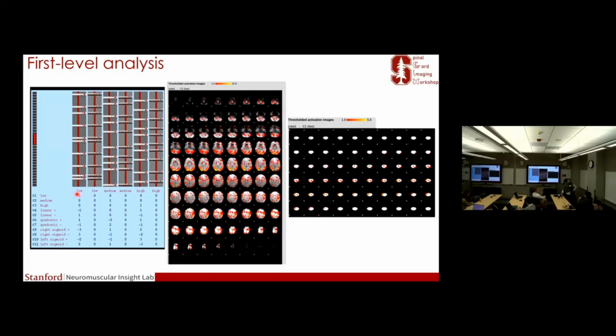Is that similar for the spine fMRI dataset too? Yes, we get the dummy volumes, but I don't know if we just don't collect them. I always forget. I think we all forget. We also remove the first couple of volumes for the spinal cord as well, but I don't know how the steady state calculations work for spinal cord. How many volumes should be removed from the spinal cord?